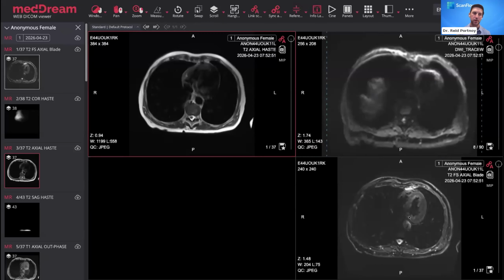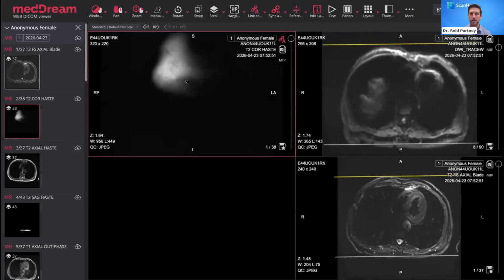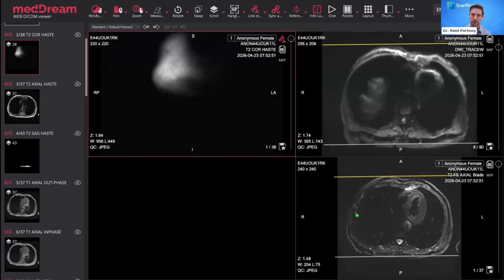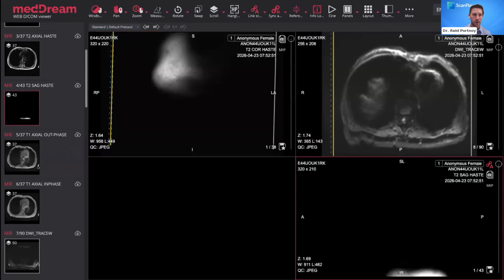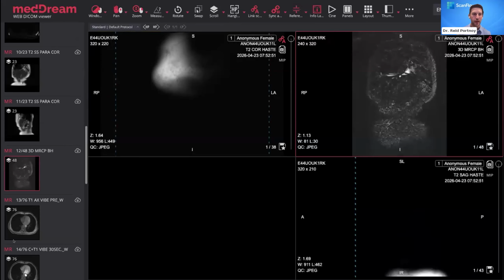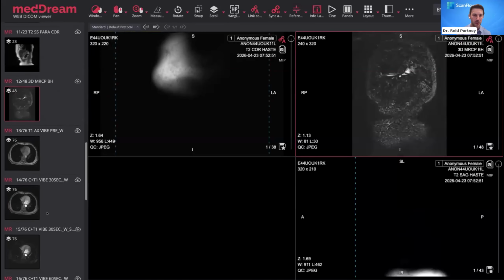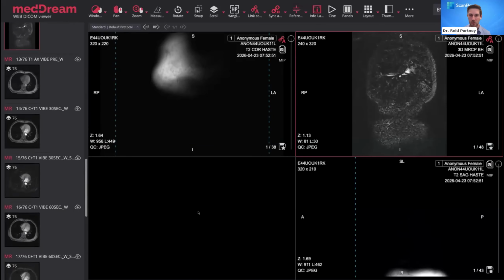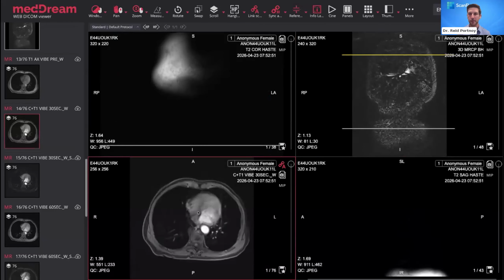So what do we have to do? If I'm the radiologist and this happens, I have to go, okay, here's my T2 coronal. Where's the SAG? Okay, here's the SAG. Where's the MRCP? Okay, here's the MRCP. And then where's the last one? Okay, looking. Okay, this one works, bottom left. So this is what the radiologist has to do every single time the hanging protocol breaks.